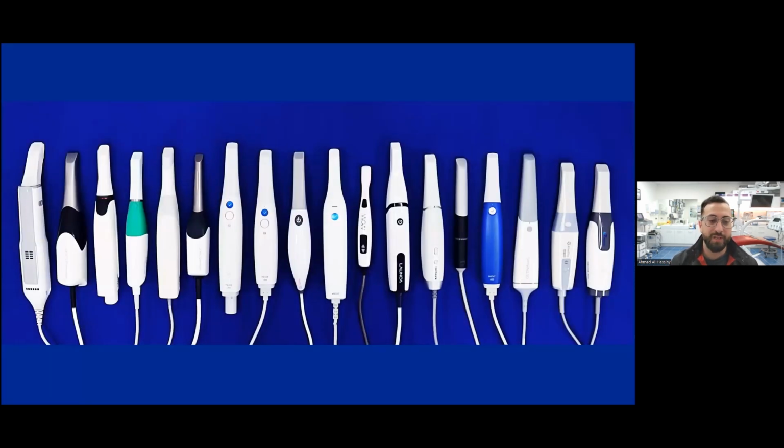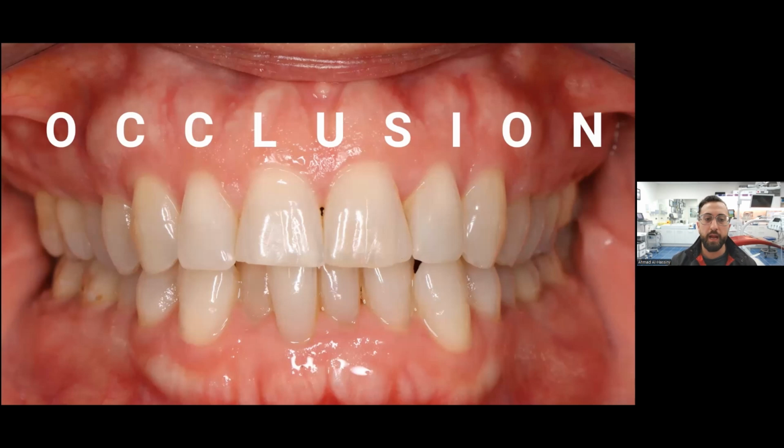I've been using scanners for a very long time. I basically use every single scanner on the market, and I've been scanning since graduation, so 8 years. There's never really been a case where I needed to pick up PVS to take a bite. I strongly believe all occlusal issues that may arise when scanning can be fixed, and I wanted to go over that.